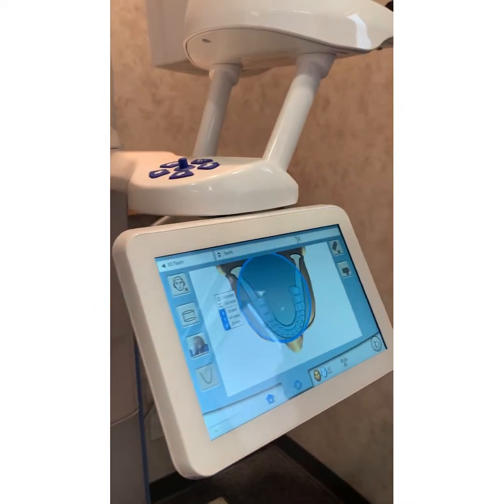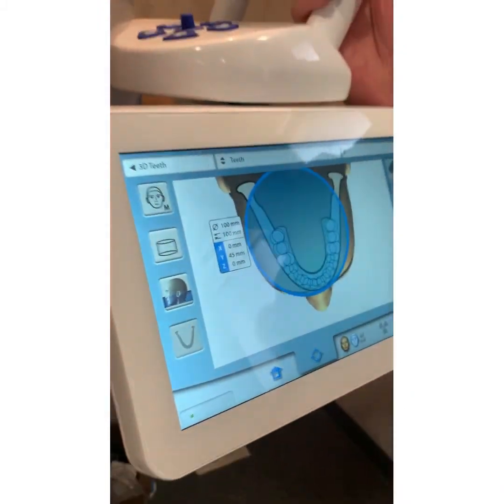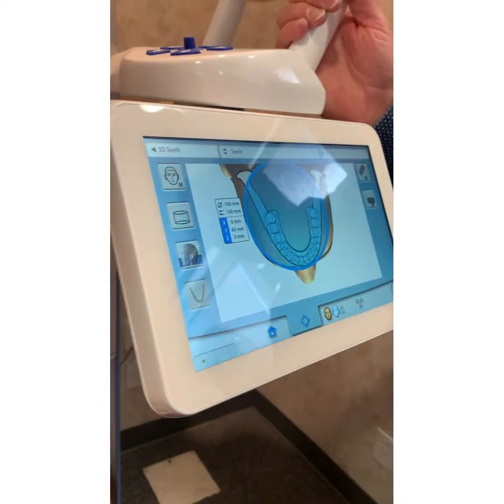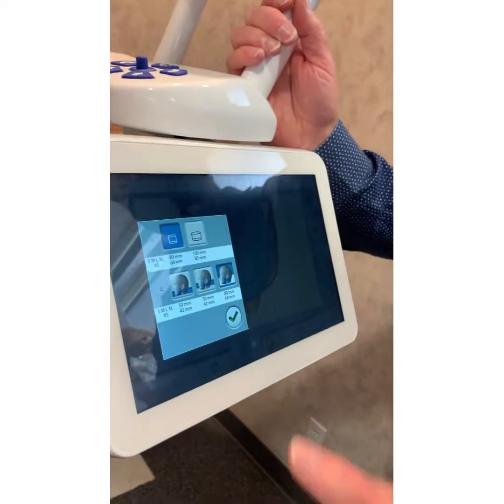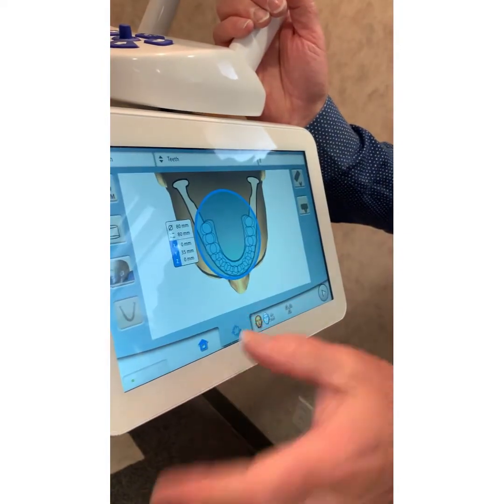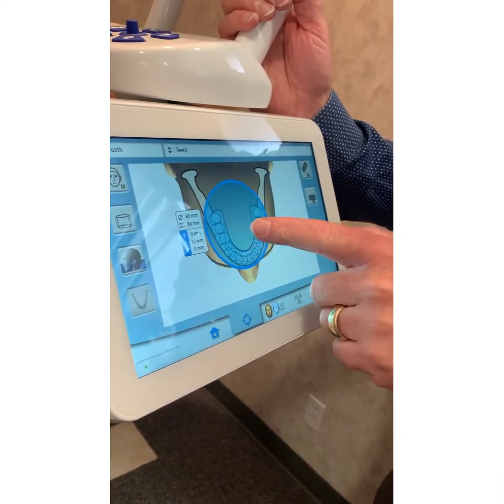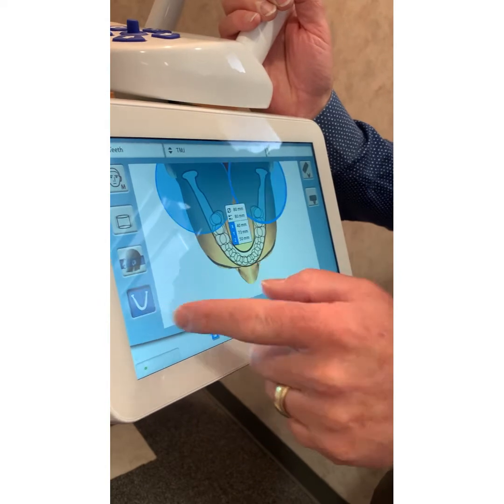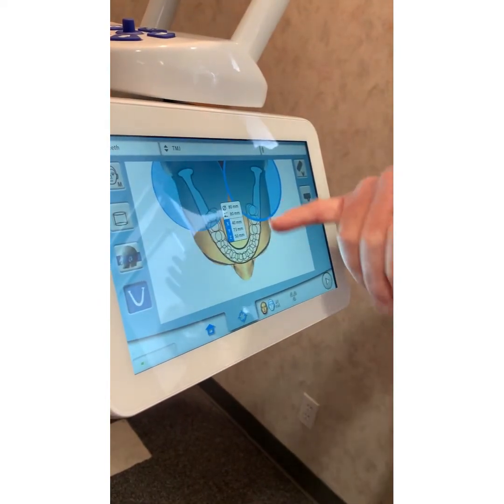All the same things apply here, with 10 by 10 for almost everybody. And I don't think we need to go through anything else. This right here, if it was on 8 by 8, you're not going to use this. If I had 8 by 8 and I put it over here, notice how I can just move this thing around wherever I want it to be, wherever I'm looking at. If I put it here and I hit my horizontal pairs, I'm going to take 2 scans and get both condyles in 2 scans. But I'm not going to get any of the anterior.